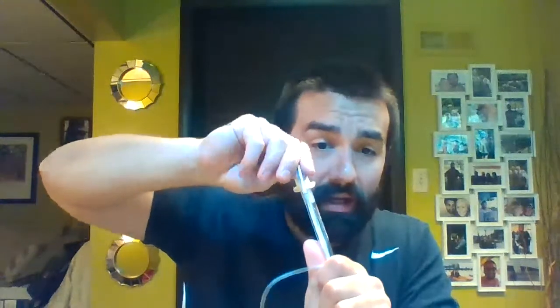going to grab the tube, or somebody is, and we need to pull that stylet out because you can't do anything with that stylet in. We can't hook it up. Be careful that you do not forget the stylet. On a lot of your guys' intubation checkoffs, I noticed you would check that ET tube and do all that stuff, but you would sometimes forget to put that stylet in until kind of late. So part of our routine, as you're checking this thing, everything's good, putting lube on, get a bend on there, put it in the package, and that way it's all ready to go.